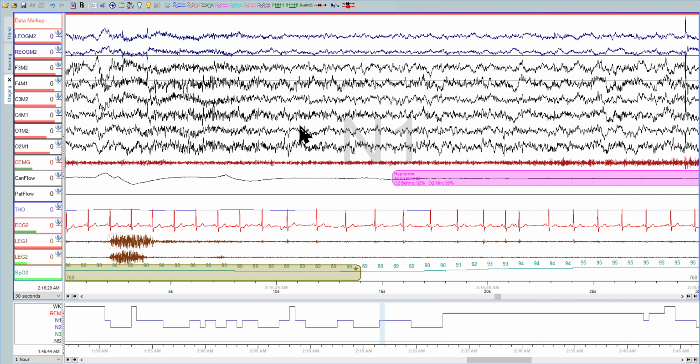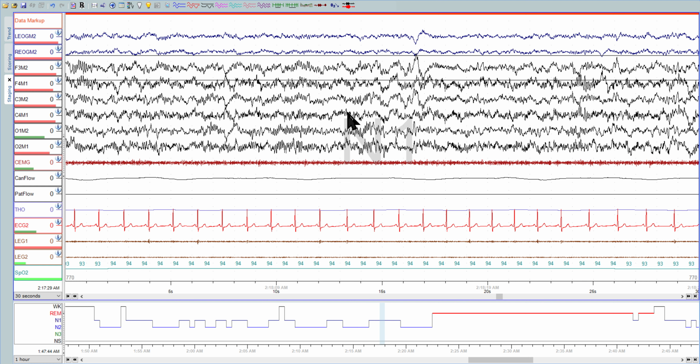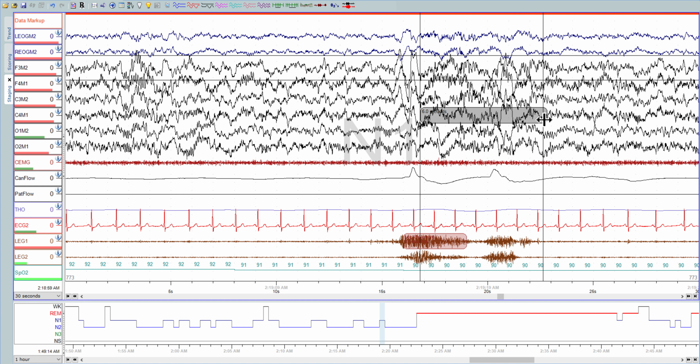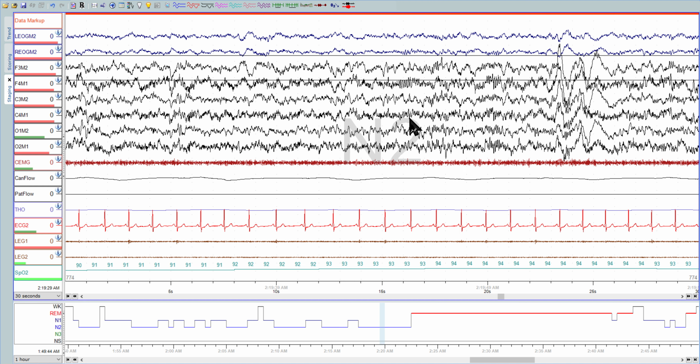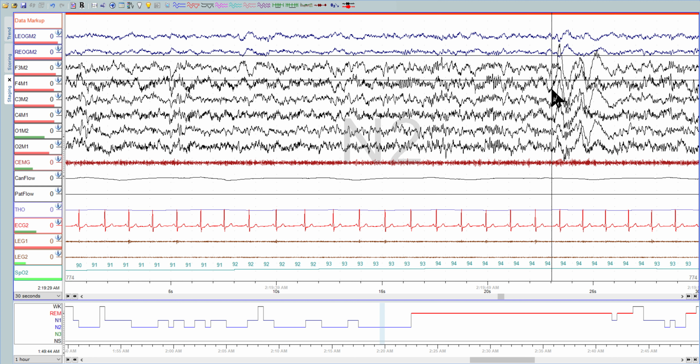I'm just kind of scrolling through a few things here. Okay, back to it. 1, good. 1, 2, 2, 2. So a bunch of 2 missed here. 1. Wait. Yeah, this one will be 1 from this arousal here into the next one. K complex here. Spindle here.